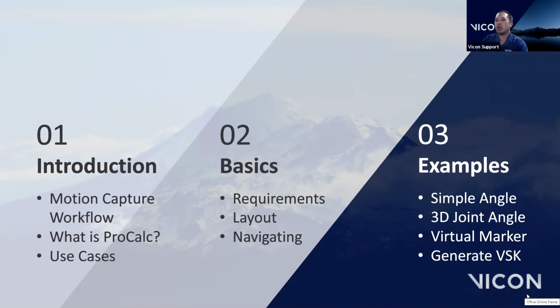So we'll look at a simple angle, we'll do a 3D joint angle, we'll look at a virtual marker creation, and then lastly, we'll look at how we can use ProCalc to actually generate a VSK, and maybe why we might actually do that.